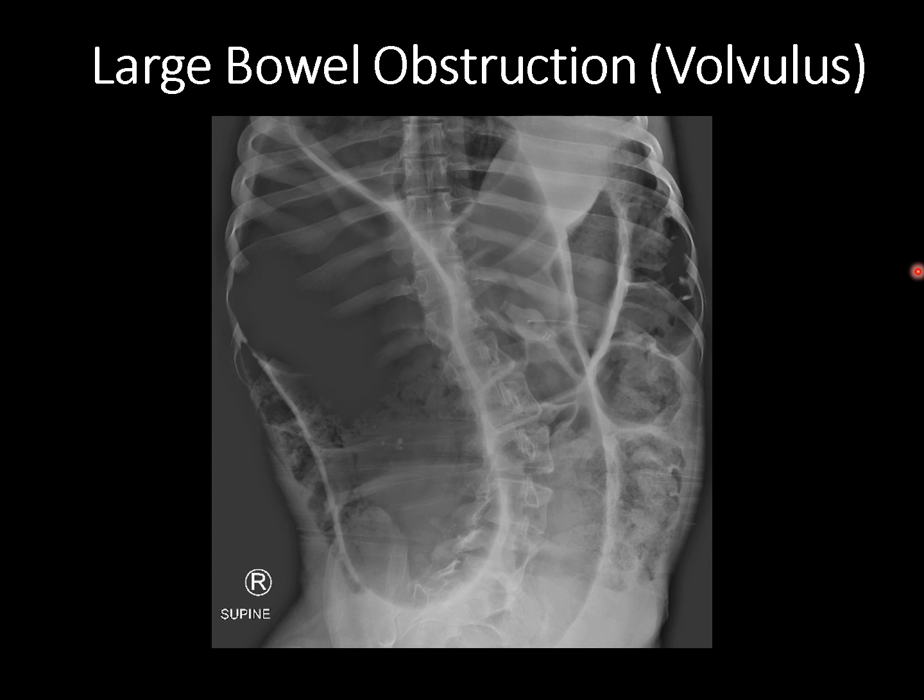It's really tough sometimes to differentiate between a cecal and sigmoid volvulus on radiograph. They do say that if this coffee bean or bowel loop is projecting, like in this case, up into the right upper quadrant, then it's more likely to be a sigmoid volvulus, whereas if it's going the opposite way into the left upper quadrant, it's more likely to be a cecal volvulus. But I don't think that's the most reliable feature because both of them can do either one. So really you need to get a CT of these patients to definitively tell what it is. If you do see a normal sigmoid or normal cecum definitively, that can also help, but it can be difficult to tell in certain cases.